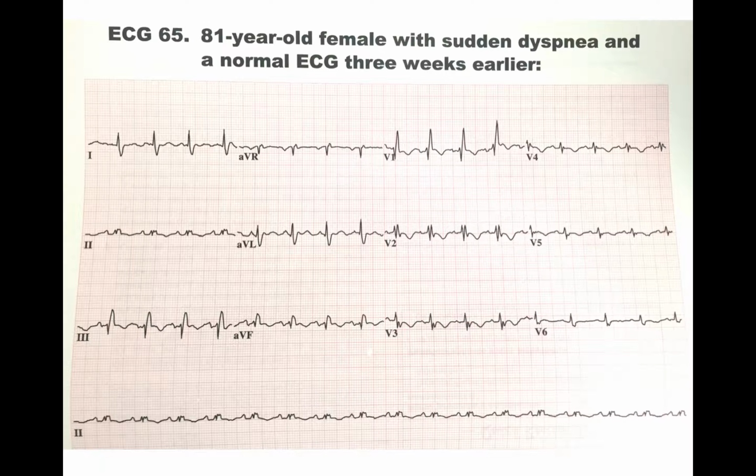Then looking at the rhythm, you see a P wave before every QRS, even though you might also see some right atrial abnormalities in these P waves, you can see them before every QRS. So now, putting it all together, we have the sinus tachycardia that you would be looking for.